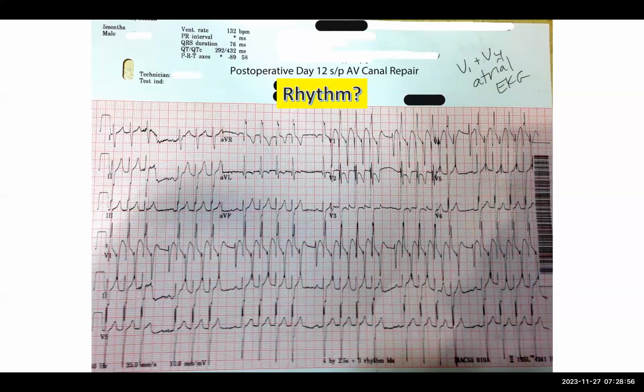I would just observe it. Yeah, there's no right answer. One could argue that this could progress, right? One could argue that it might improve, but probably this is not a dangerous rhythm, particularly since it appears as if conduction is not bad. For example, I'd want to know what happens at 120. Maybe at 150, this heart rate is like 155 in the atrium. Maybe at 147, the patient conducts 1-to-1.